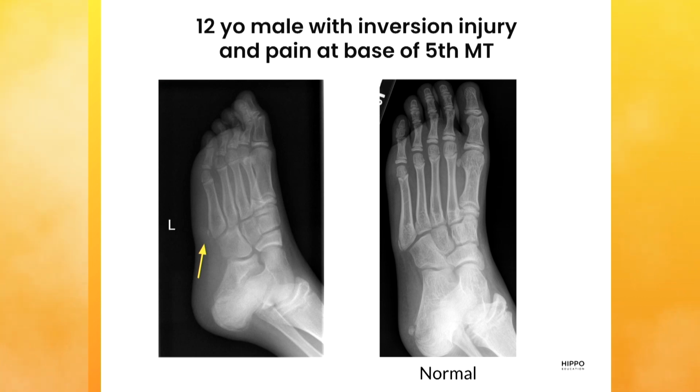Right. Another scenario I often find is I'll get an x-ray because they have pain elsewhere, and then you'll see some of these ossification centers, and then we're all going, I got to go back and touch the kid in that area. Yeah. And I find that to be very helpful. If they're not tender at all and it looks nice and smooth and round, then I may be like, okay, maybe that's an ossification center, but I'm still going to call Dr. Sato. That is super, super helpful.